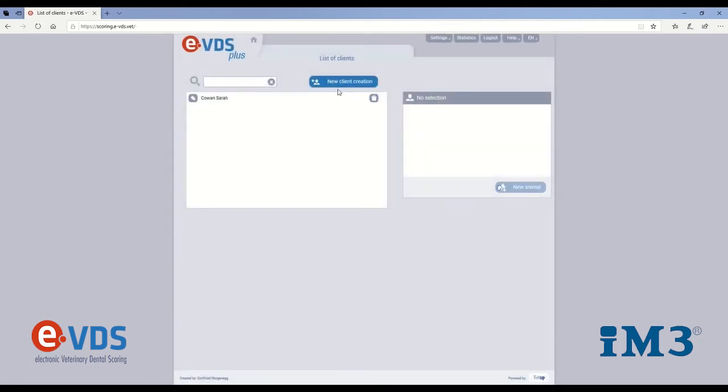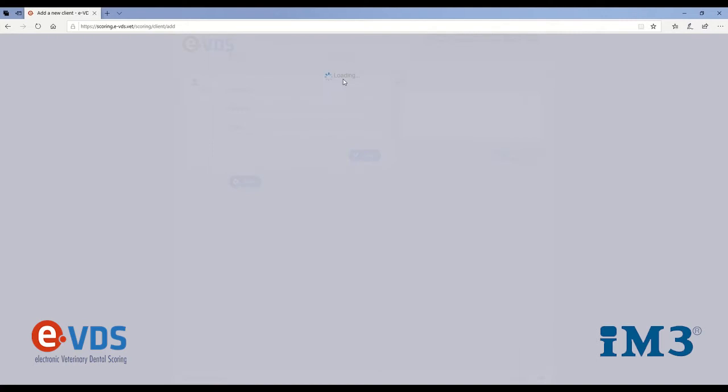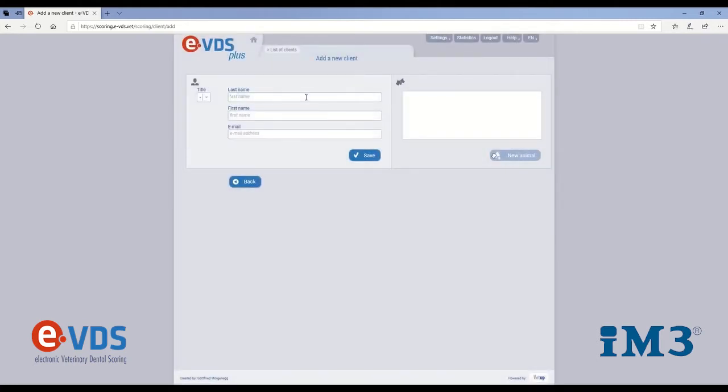Then you can select a new client, insert their last name, their first name, and their email address.